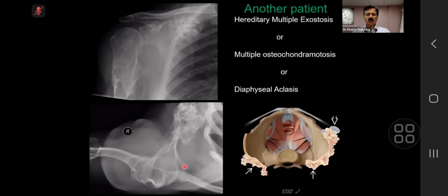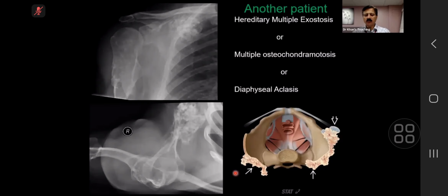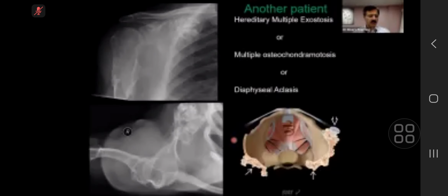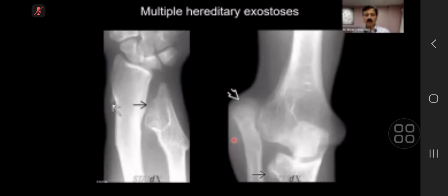Another case here, it's sort of an aunt Minnie. The only case you should be worried about in the exam is with malignant transformation. They will show you a case in which there is malignant transformation. There is a bit of discrepancy in literature. Some people think up to 10%, and there are other studies also. So they will show you cases in which there is malignant transformation.